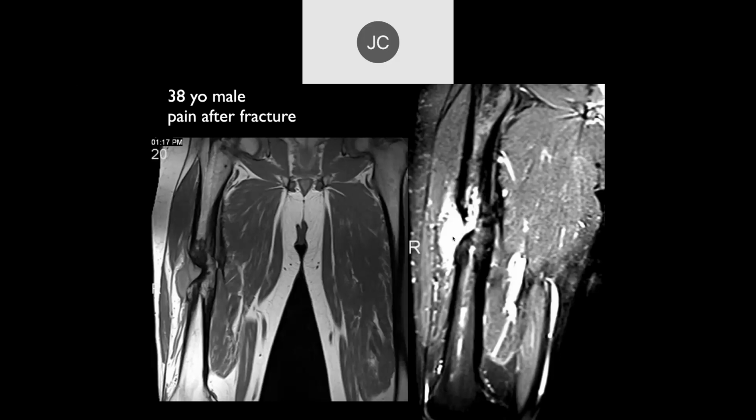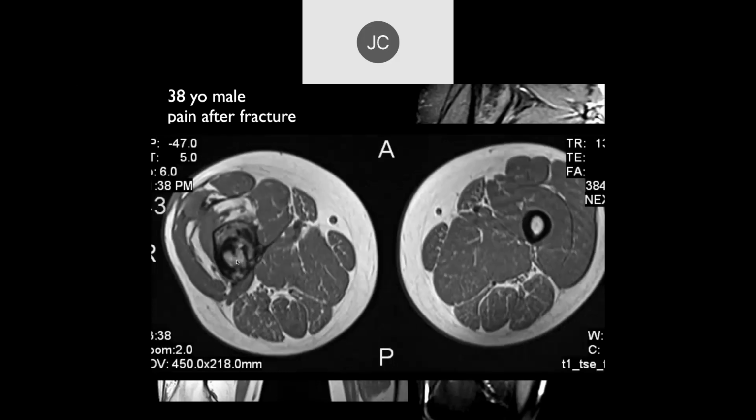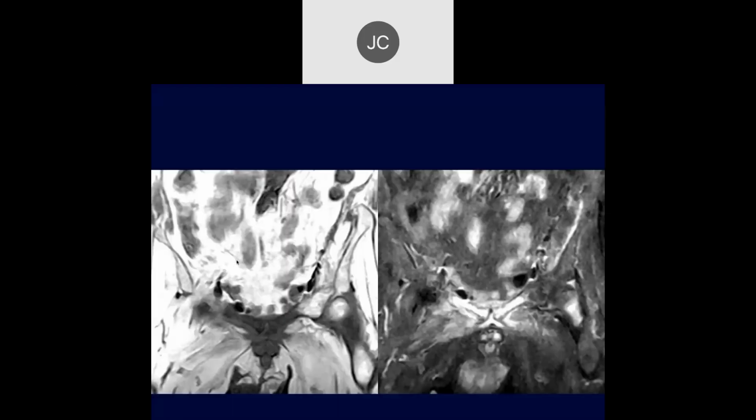So what are you concerned about? Again, osteo. Probably a little bone fragment. Yeah, so another case of another type of appearance of chronic osteomyelitis. It was probably an open fracture. All right. Got a lot of increased signal at the pubic rami there, and also within the left femoral neck, maybe.